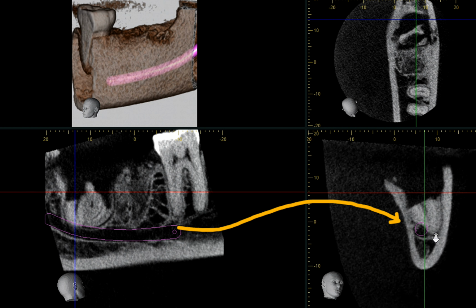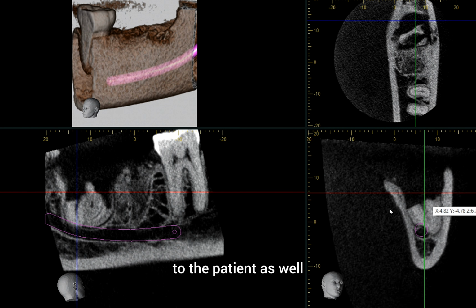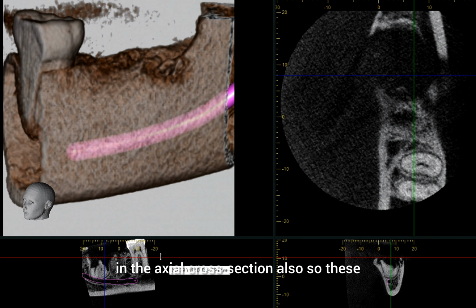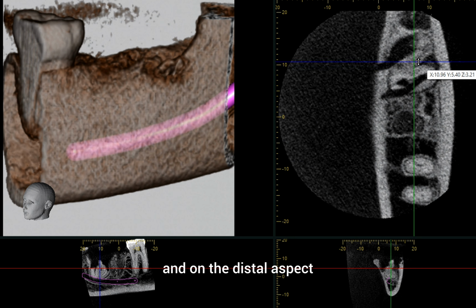So extraction of the root piece can also lead to paresthesia, and hence the symptoms need to be explained to the patient as well. You can see this in the sagittal cross section. Similarly, you can see this in the axial cross section also. So these are the burr marks which are seen, on the mesial aspect and on the distal aspect.